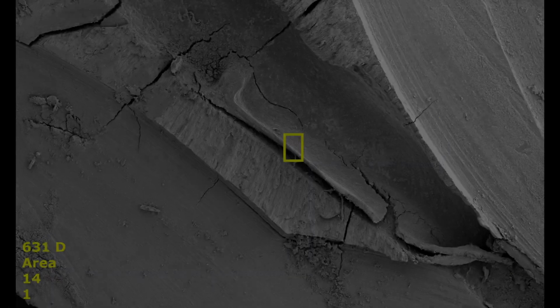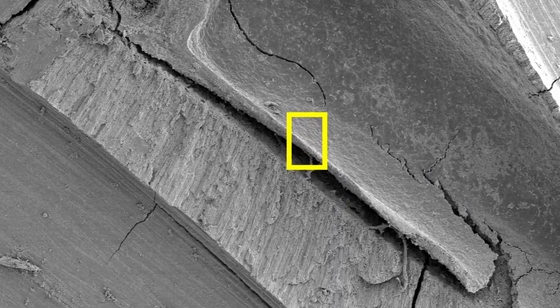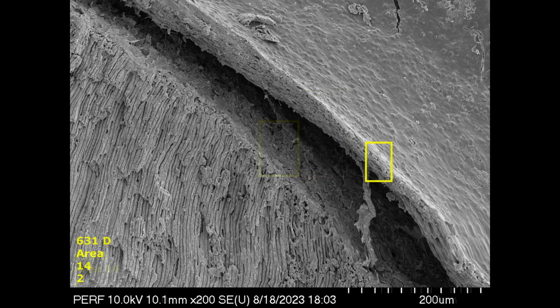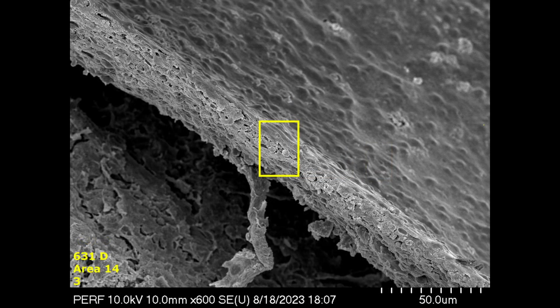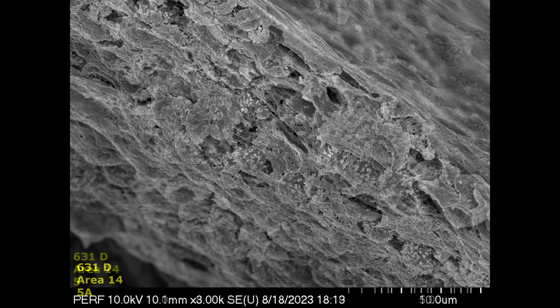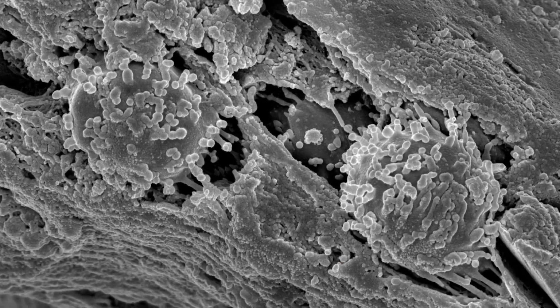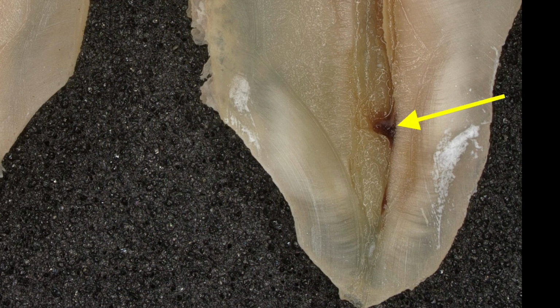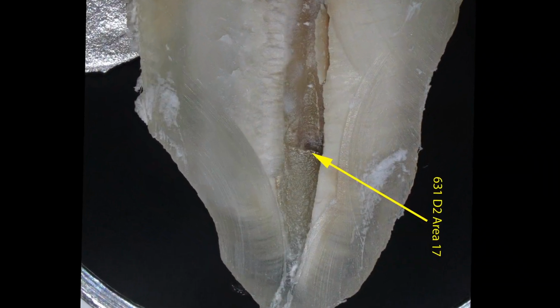As we zoom into that tissue, it appears to be a sheet of pulpal tissue, but a closer examination of the edge of the tissue shows that it is primarily a connective tissue infused with leukocytes. The inference is it is necrotic pulp, which is mostly pus. When we look at the right side of the split root in the same area, just to confirm, we see a tissue that is mostly leukocytes.